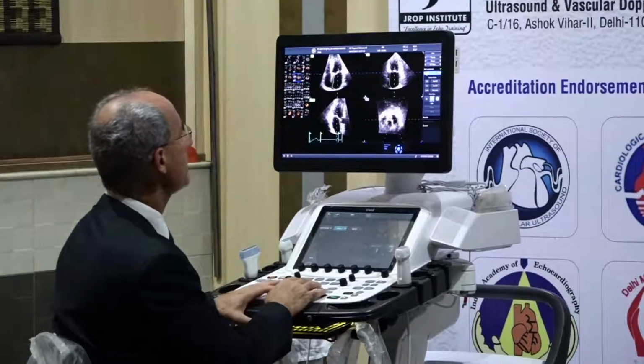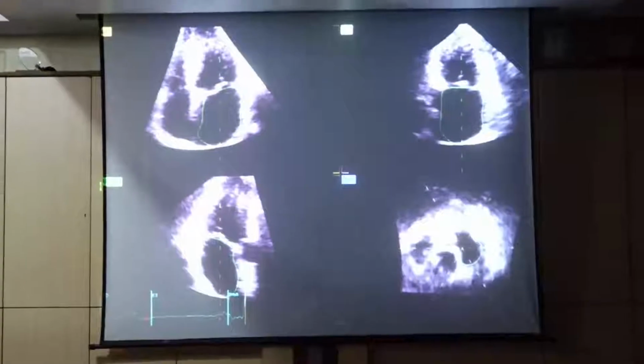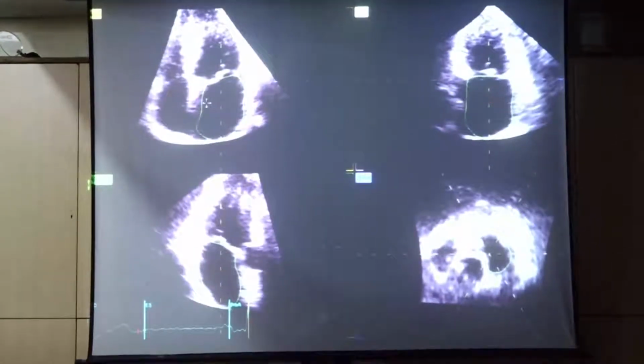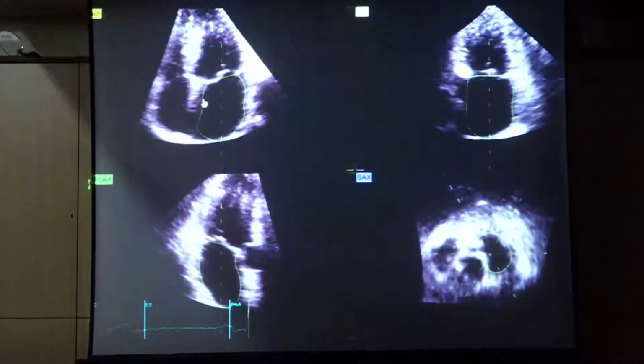The walls of the left atrium are quite smooth, no trabeculations, so the software is very accurate. In any case, if you needed to change anything, it's the usual way. You go on the endocardium you wanted to change, click with the left button of your mouse, it becomes red, and you just drag the endocardium to the correct position that you wanted to set for this particular patient.